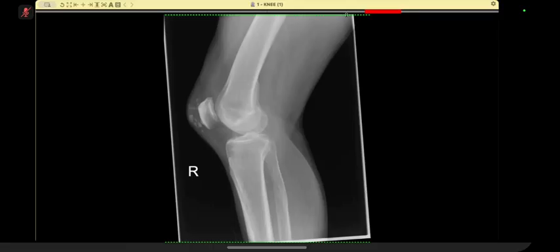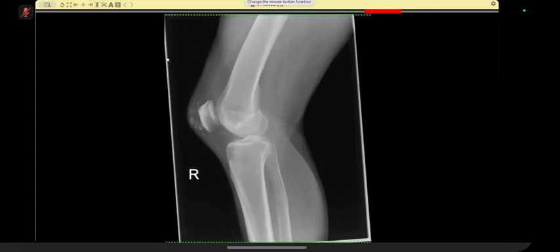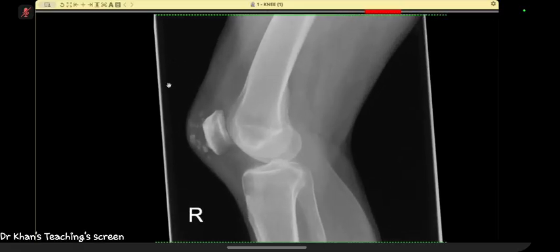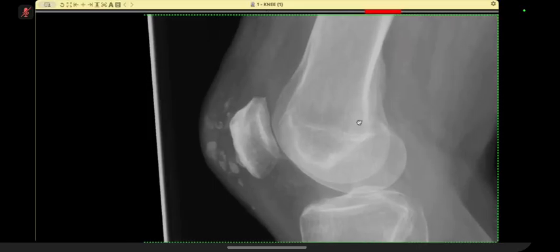I would also like to see if there is any related tendinopathy which might be the cause in this patient. I can see that the calcifications are centered in the prepatellar area and are not in the superior or inferior aspect of the soft tissues of the knee joint. The calcifications are quite variable in shape, and a few of them also demonstrate internal foci of low density.